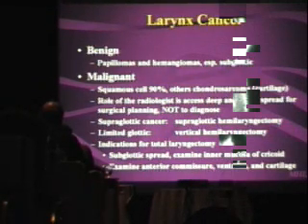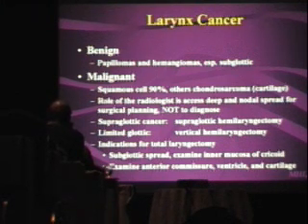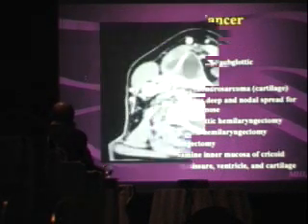Okay? I said there's not a big differential. There is at least some differential. Often you can get a hemangioma in the soft tissues there, especially in younger people. So you should consider that. Papillomas on the mucosa, hemangiomas, especially along the trachea in the subglottic airspace. And you also always want to look at the cartilages. You could get a chondrosarcoma forming a mass. And if it's submucosal, then that's the one place the endoscopist is not going to be able to evaluate.